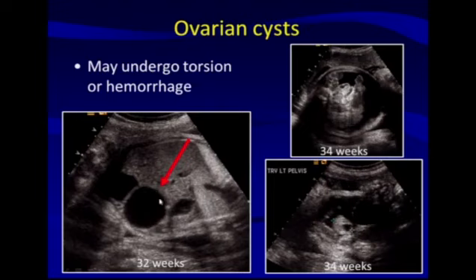We could see a cyst here. There was a little bit of echogenic material lying dependently within this fetus from an ovarian cyst, and 2 weeks later, on ultrasound, you could see there was ascites and a normal ovary here. What had happened is this cyst had actually ruptured, leading to ascites, and the cyst was no longer seen. And that is entirely possible prenatally.